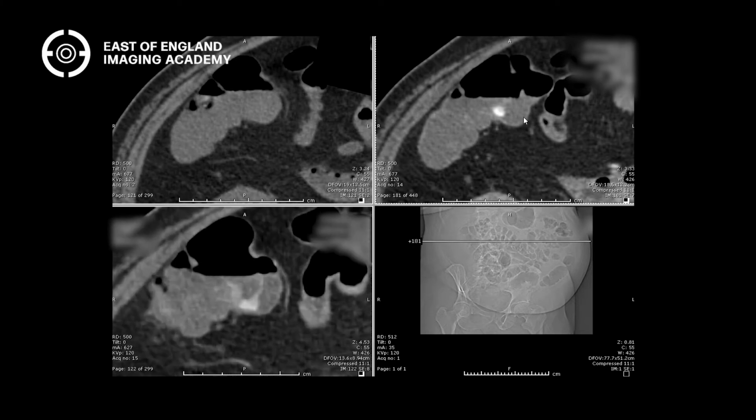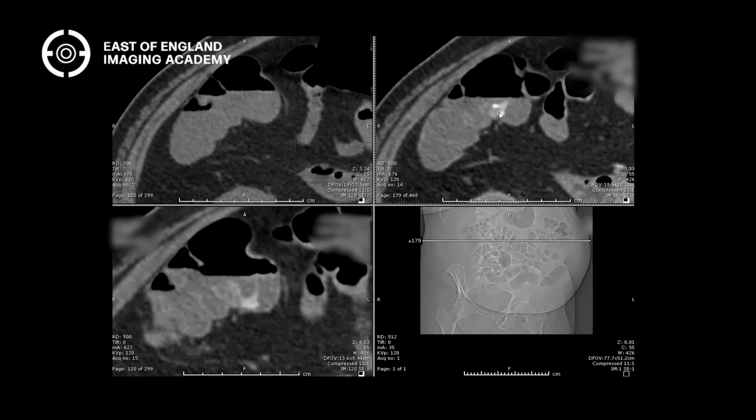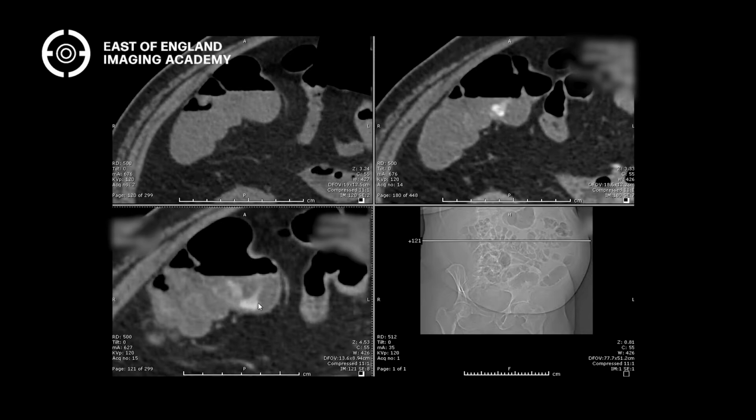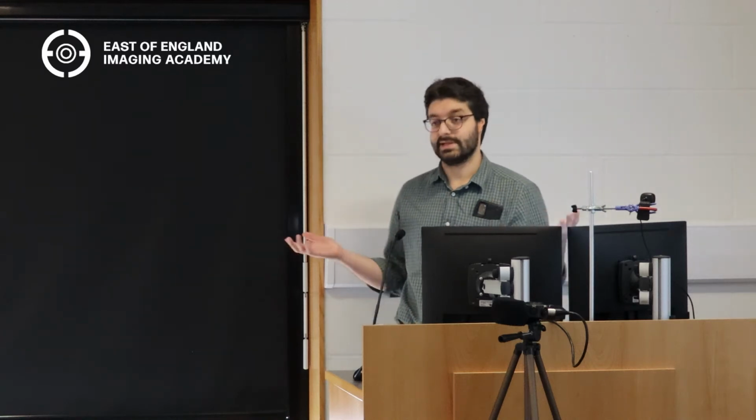You see here, you can see there's a little jet as well. You see a little jet of blood coming out, and there's a little sort of beginning to puddle here. But on the portal phase, you can see it's beginning to pool and form a little pool of blood. So that is how you diagnose bleeding, GI bleeding. Okay, that's why you do a triple phase.